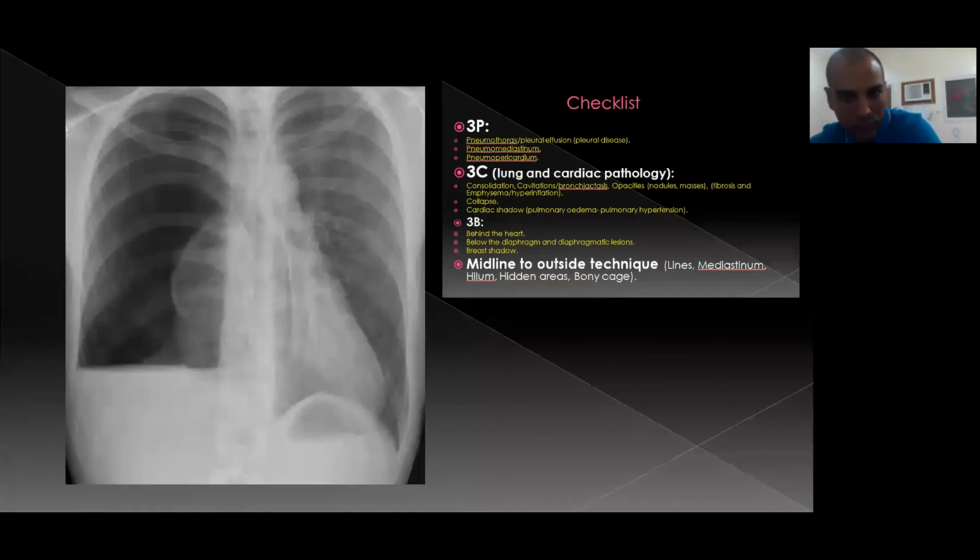Pneumothorax or pleural effusion. On the right side, yes, there is flattening of the diaphragm. Okay. And the costophrenic angle is not clear. Yeah, you are right, not clear. Okay, this is regarding the pleural effusion. So the possibility is a pleural effusion on the right side.